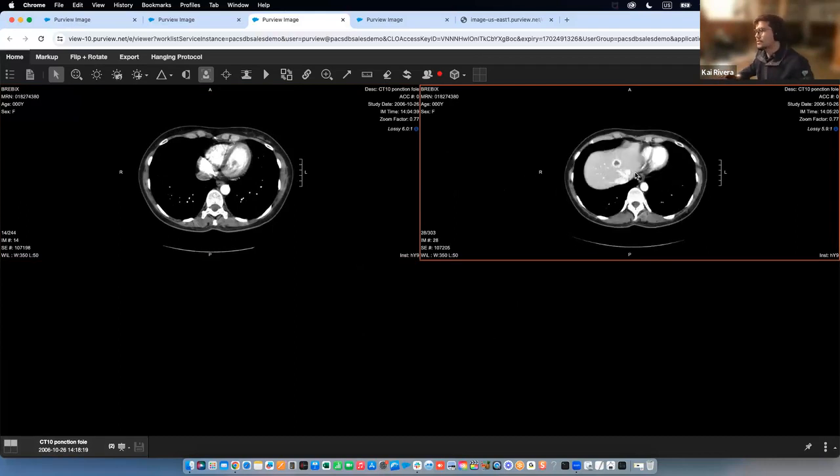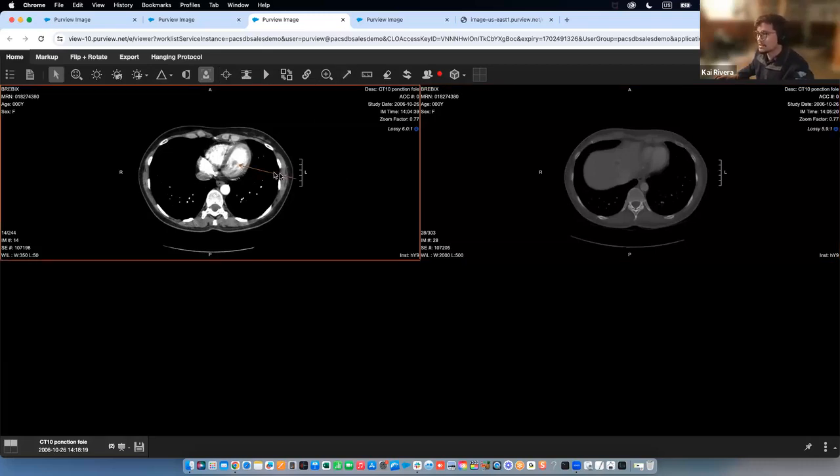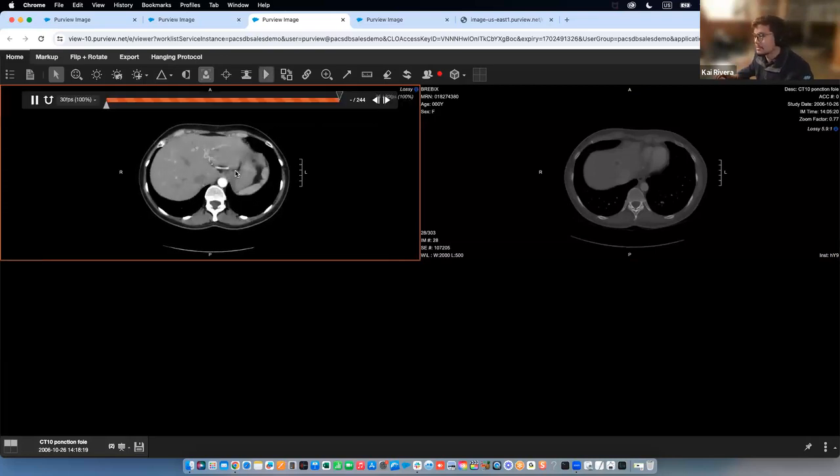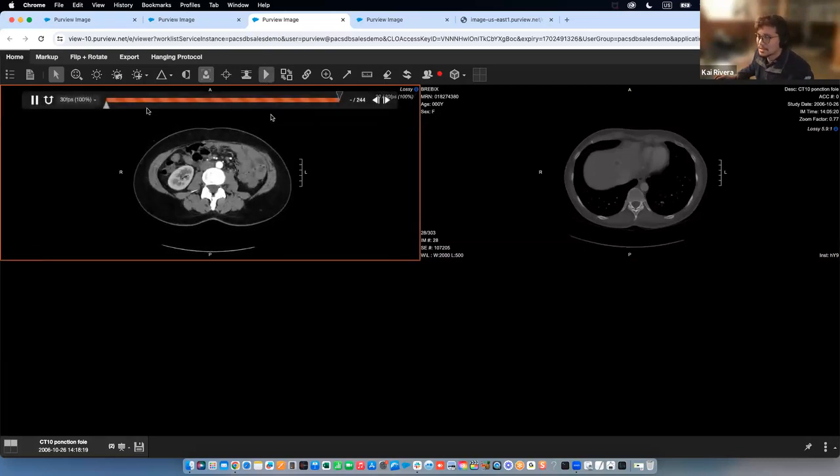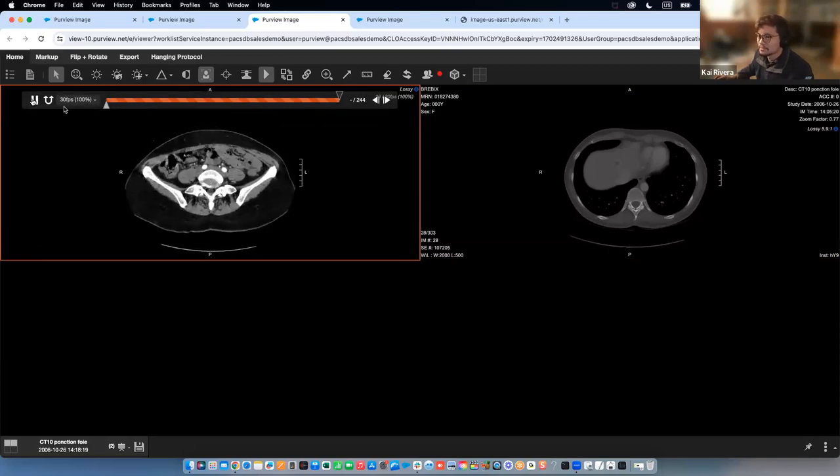What we found is that even for users that start with Horos, this particular viewer essentially has all the tools that they might need, whether it's to adjust the window levels for a particular scan, or perhaps sharpen the images, being able to add markups, right, or annotations. In addition to that, there's even support for cine viewing. So if I have an image with multiple slices, I can manipulate the cine and play it like a video.